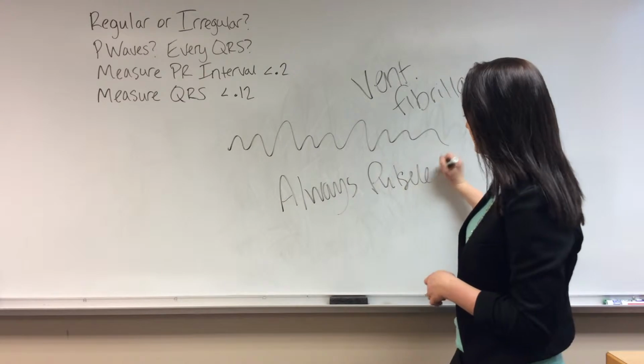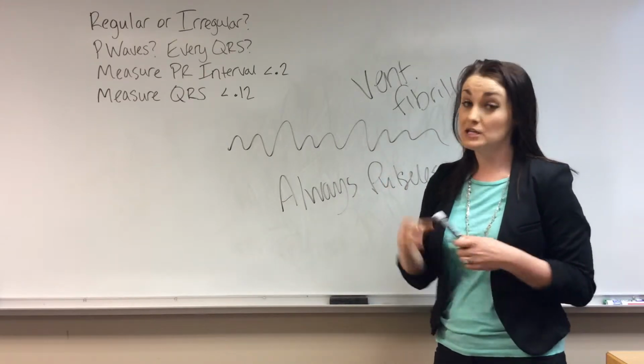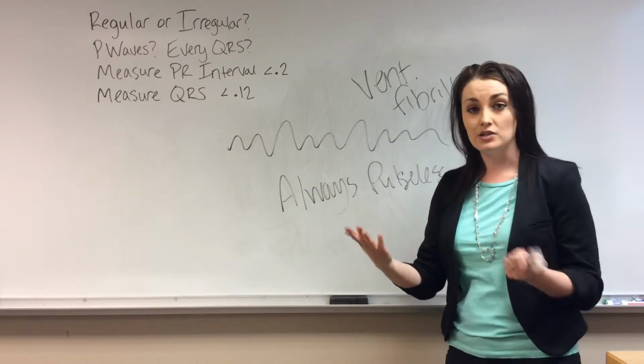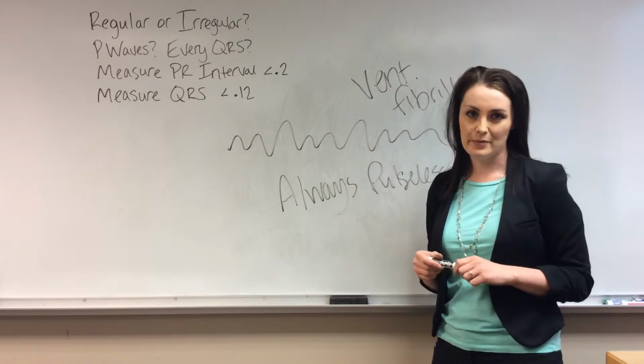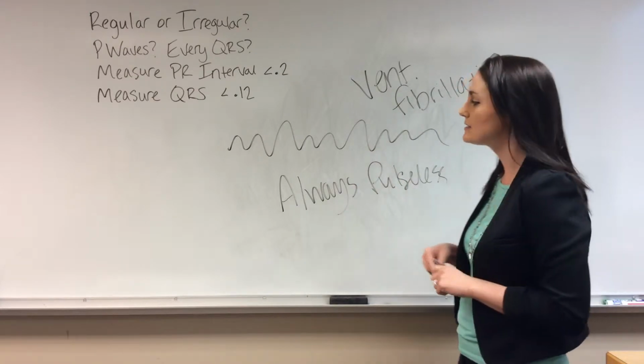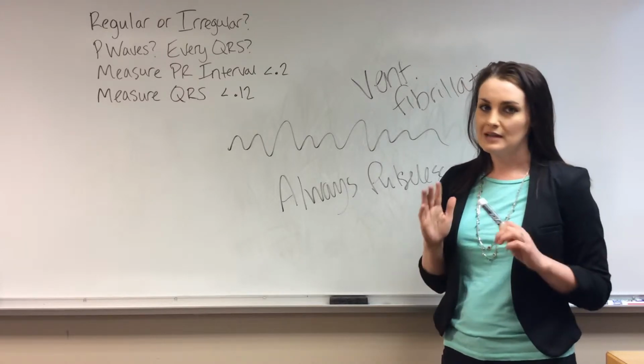Again, when you see this on the monitor, you instantly assess your patient. It may be an issue with the leads. If they're talking to you and they are alert, they aren't in VFib. It may be an issue with your monitoring leads. But if it is true ventricular fibrillation, there's never a pulse.